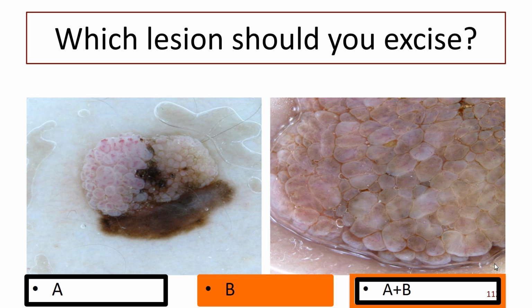One of those floppy ones. We have used the word already, papillomatous nevus. Okay, it's a papillomatous nevus, and all the clods are the same. They're different in size and shape, but basically it's all clod pattern. You see the blood vessels? They're not as sharp as in here, and they're all more or less the same, and they're short curved lines. Can you draw us a short red curved line? By conventional pattern analysis, that's called a comma. In modified pattern analysis, it's called a short curved line. You can use either. I think comma is pretty easy, so comma's fine by me.